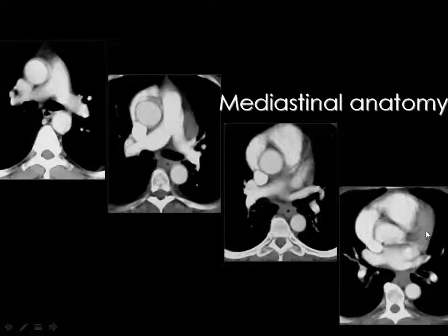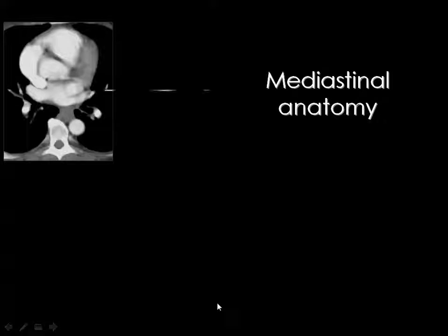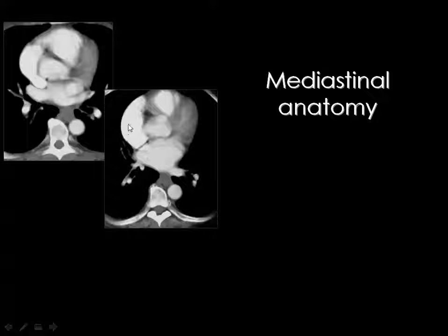And the left ventricle is adjacent to the right, and the right is adjacent to the atrium. Then the final chamber, or the remaining chamber, will be the left atrium. This is the left atrium, left ventricle, right ventricle, and right atrium, and this is of course the aortic root. Then if you look carefully here, this is the right atrium, this is the left atrium, and this is the aortic root, this is the left ventricle, and this is the right ventricle.